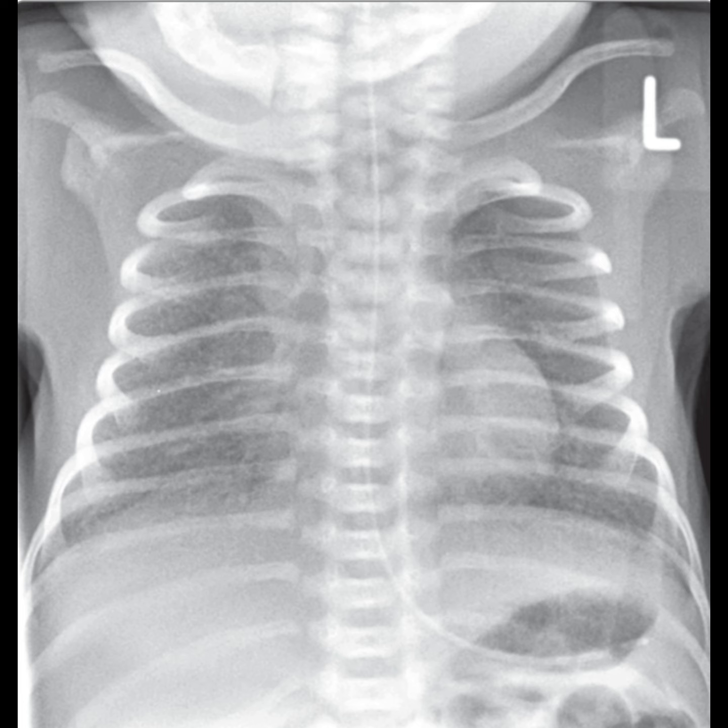Now, if we're dealing with a premature neonate, the first thing that comes to mind is respiratory distress syndrome, RDS. However, it's crucial to consider other possibilities. For instance, the appearances could also indicate transient tachypnea of the newborn, TTN, especially if we're talking about a term baby. Another possibility could be diffuse pneumonia, particularly if the baby shows clinical signs of sepsis. The key here is understanding the context and correlating the radiographic findings with the clinical presentation.